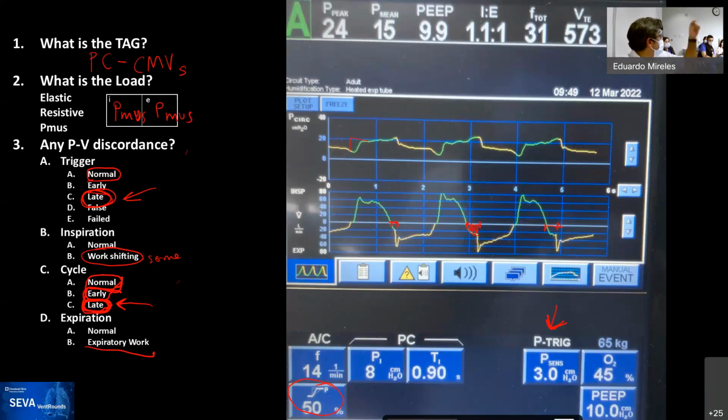So the patient is exhaling during inspiration. The pressure is high and the patient is pushing all the air out. Then the breath ends and the patient continues to exhale forcefully and then takes a breath in. So the patient is actively inhaling, actively exhaling, as you recognized.